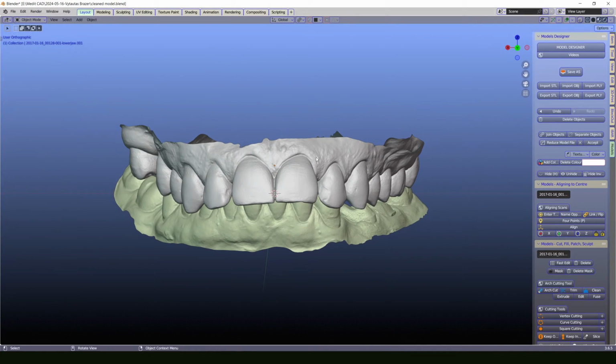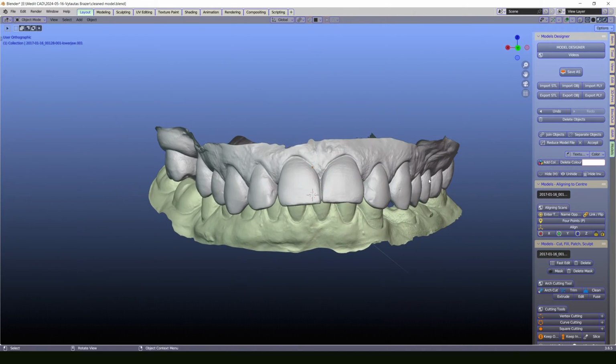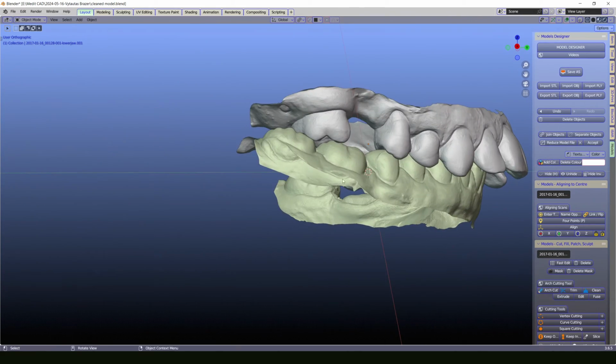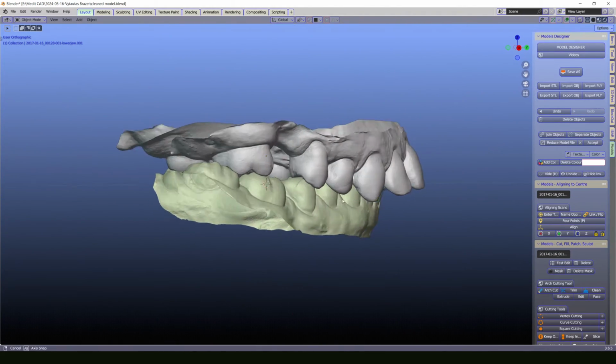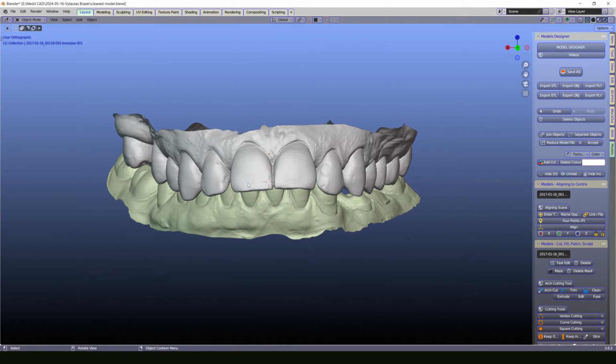Hey, have a second look at your models. Maybe they are too high. If you expect that some parts are protruding or too long and may influence you with too long printing, you can still make some adjustments and some rough cuttings. How to do them fast enough and for the whole model.